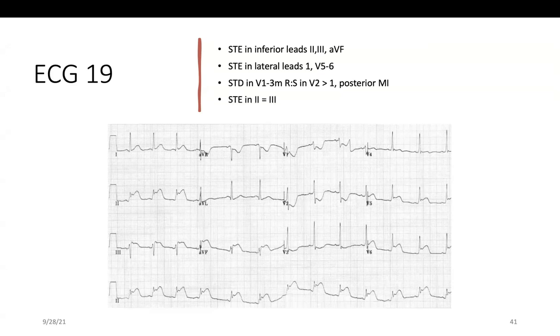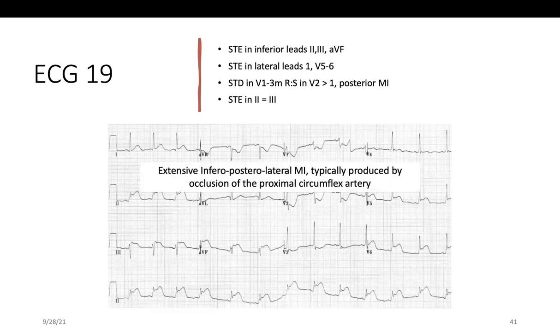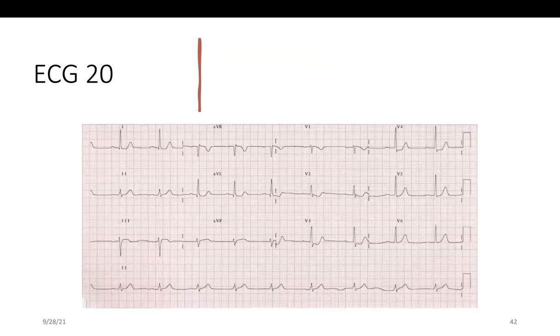Exactly. And ST elevation in 2 and 3 are almost equal, or 2 is more than lead 3. This goes with what? Which artery? CX. Okay, it goes with proximal circumflex. As you said, there's some lateral involvement because it's the circumflex. 20.